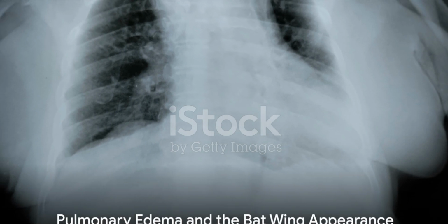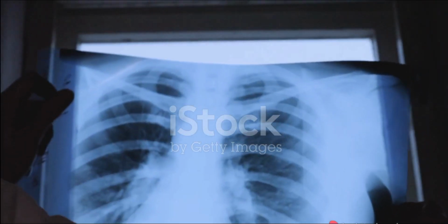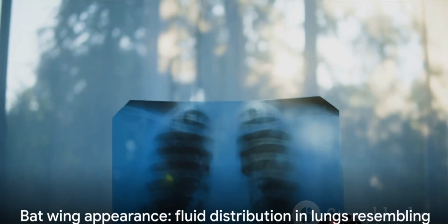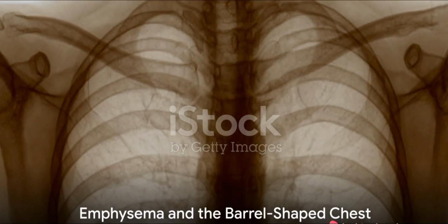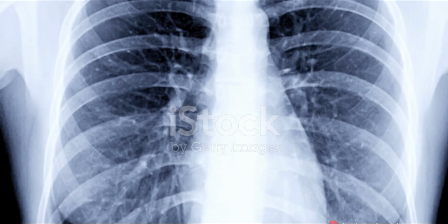Next, we have pulmonary edema, a condition where fluid builds up in the lungs. This condition gives a bat wing appearance on a chest X-ray. Imagine the spread wings of a bat. The pattern of fluid distribution in the lungs mimics this, giving it its unique name. Emphysema, a type of chronic obstructive pulmonary disease, is associated with a barrel-shaped chest. This term is used to describe the physical changes in the chest due to the disease, where the chest appears larger or rounder than usual, like a barrel.